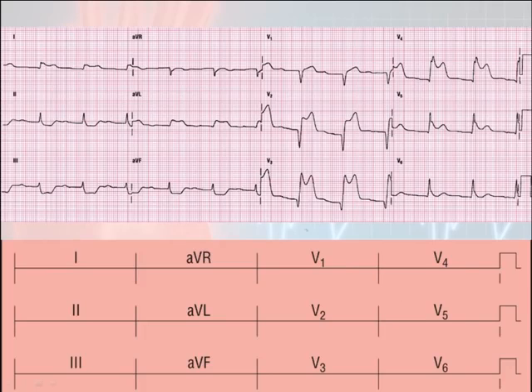Now, if you look at this one really fast here, what did I say before? We want to look at ST segment elevation. There's elevation, there's elevation, lead 1, AVL. It looks like we might have some elevation here in V1. We definitely have it in V2 for sure. V3, V4, V5. And this might be considered elevation. We're not really sure, but it could also be in V6.